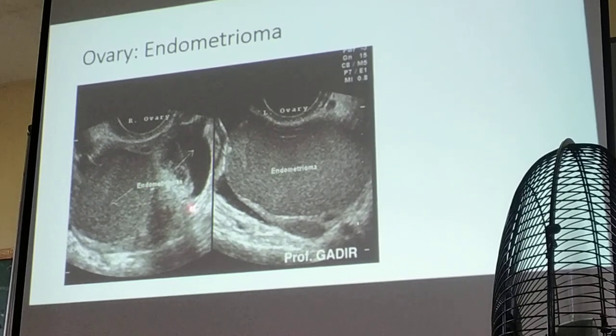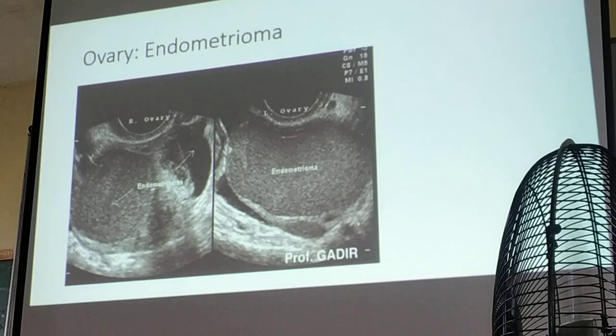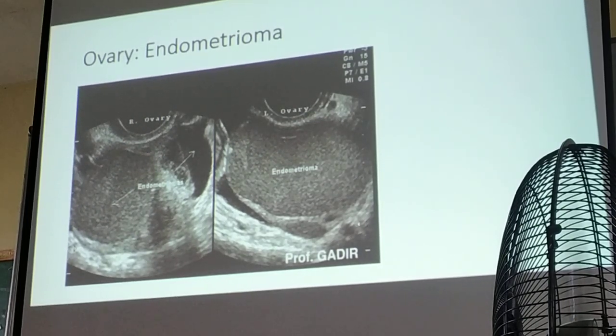It's hypoechoic. So if I'm going to ask you solid or cystic, identify the lesion. Is it solid or cystic? Endometrioma, solid or cystic?